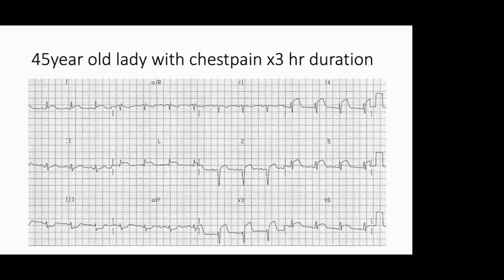Can anyone read the ECG from the basics? Can any of the listeners?